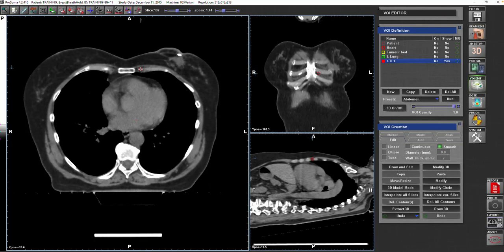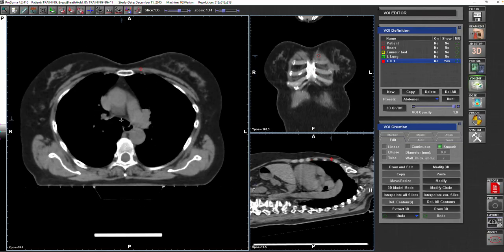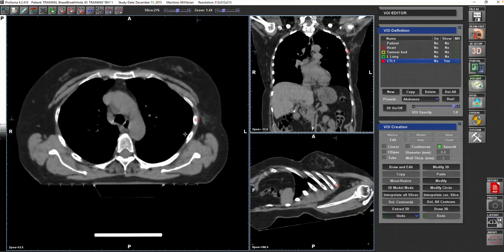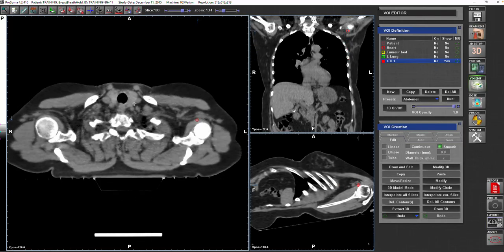So it's up to you which way you want to do it. It's either the simple method of the coronal view, 1, 2, 3, 4, counting and moving with it until you join the sternum, or you go from high up one by one.